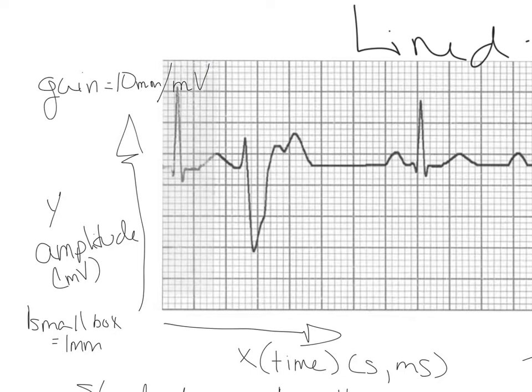Okay, so that gain is going to tell us, and this goes into clinical settings as well. If you have someone with left ventricular hypertrophy, the way you know it's hypertrophied is by a really, really tall wave. A lot of times, though, when you're printing out the paper, the gain itself may not be on the paper. You may have to dig in a little bit deeper to understand what the calibration of the gain was, because it's not always given to you in broad daylight. You have to dig in and see.